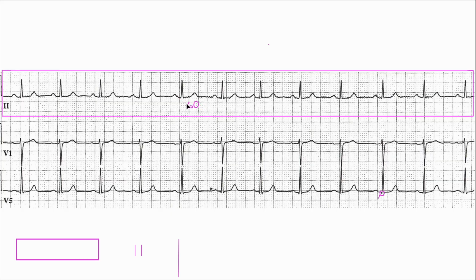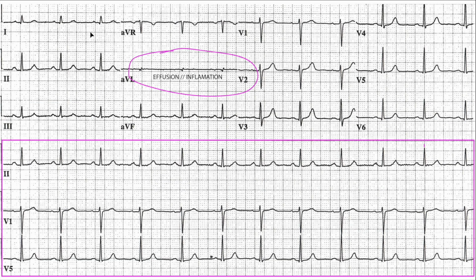So you cannot be certain that this is atrial rhythm as well using leads V1 and V5. So what can you do? Well, if you go to your 12-lead ECG, you take a look at your lead 1, you take a look at your lead 2, and you take a look at your lead AVF. If all 3 of those are upright, you have something that's coming from the sinoatrial node.